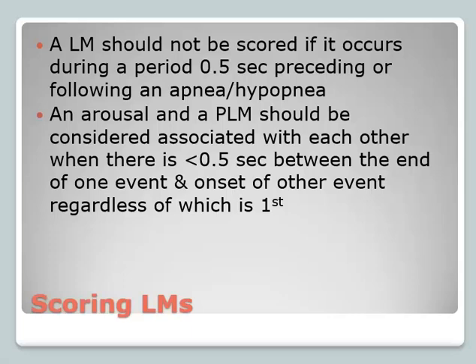That's why I said it doesn't matter how long the arousal occurred, but just try to be as precise as possible with marking the start of the arousal, because that's what you want to look at. If you have a leg kick and arousal, which came first? If the leg kick came first and then caused the EEG change, you can say that is a PLM arousal, an arousal as a result of the leg kick.